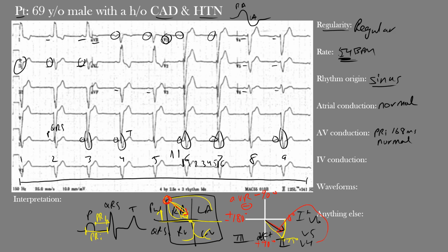And if we look here, we can actually see that the QRS interval is certainly prolonged, okay? We mentioned that earlier. In fact, the QRS duration here is 158 milliseconds, which is much beyond that normal upper limit. So it's actually prolonged here. Okay, so let's take a look at that. Remember, for QRS duration, we're looking from the beginning of our QRS complex to the end of it. That duration, you can tell, is certainly prolonged here.